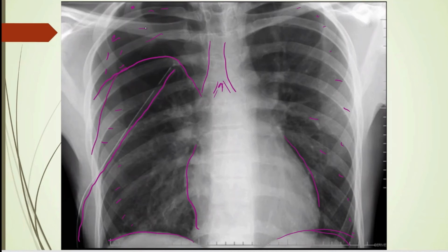Oops, looks like it comes down here actually. So this patient still has a pretty good size pneumothorax. I would check this chest tube and make sure the chest tube holes that you find are all the way inside. Make sure it's not plugged, but something's going on and this needs to be corrected here. So you've picked out, patient has a pneumothorax still in spite of already having a chest tube inserted. Probably needs to go in a little bit further.